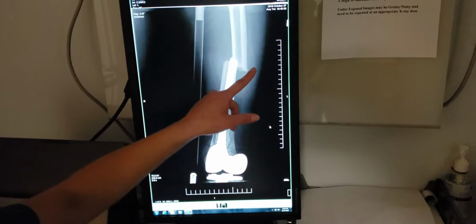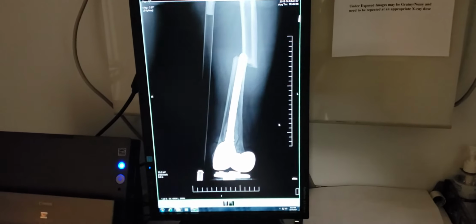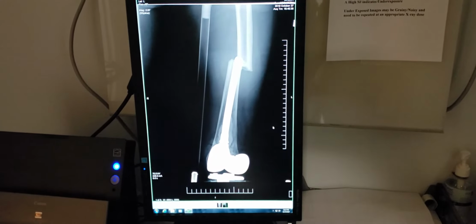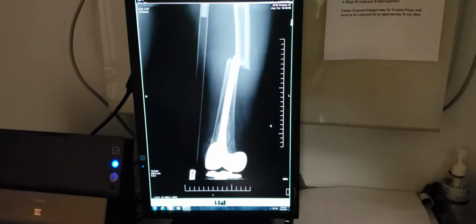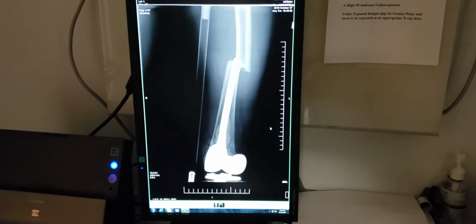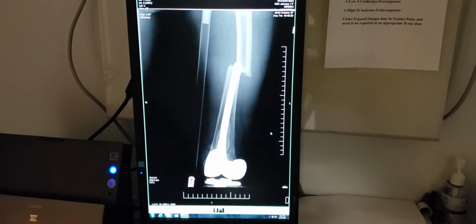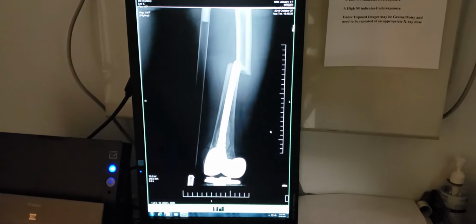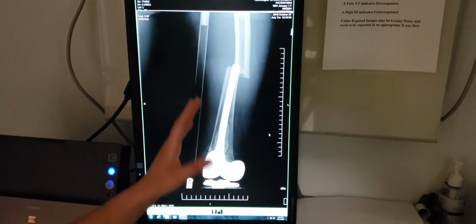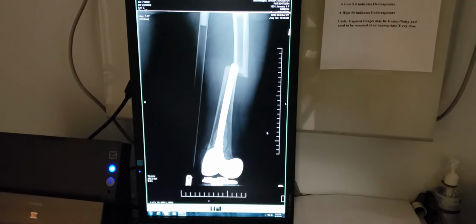You could see the transverse fracture better, of course, and soft tissue. So for rotation, I said yes, like I mentioned earlier, most likely because of the patient's fracture. But since we can't adjust it, there's nothing you can do about that. Maybe a tube angle could help compensate, but I would say it's better to see the anatomy as it's visualized, not mess with it so the doctors really know what's going on. I would think that would be better for them.